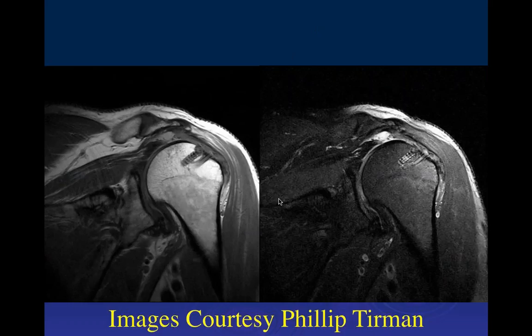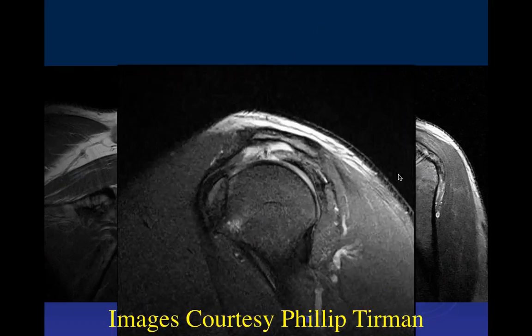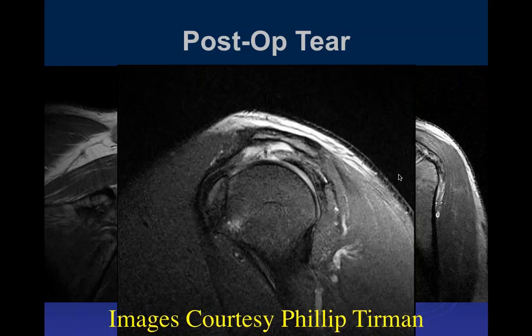And that just showed a case where you have a tear next to the surgery. Here's a case where we have postoperative changes with a clear retear of the tendon, large defect.